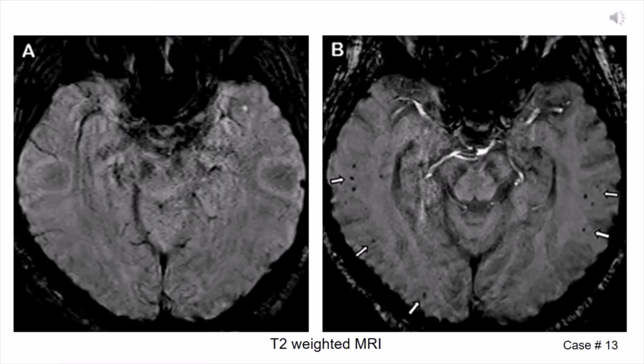Case 13. T2 weighted MRI images of a SARS-2 positive 64-year-old man were acquired. Image A was acquired 1 week before the current hospital encounter and during workup for headaches. Image B was acquired after 23 days of mechanical ventilation in the ICU. Image B shows multiple juxtacortical punctate microhemorrhages in bilateral temporal and right occipital lobes, small arrows.